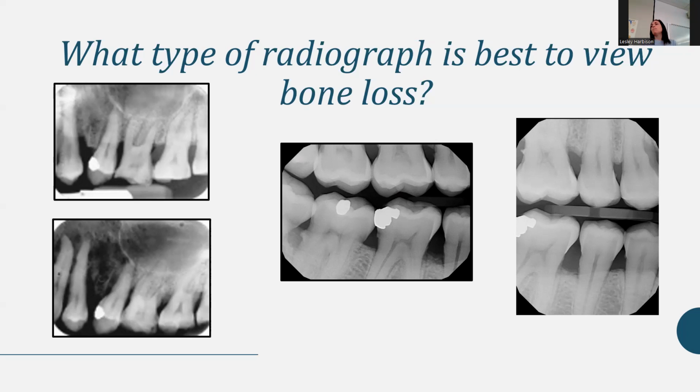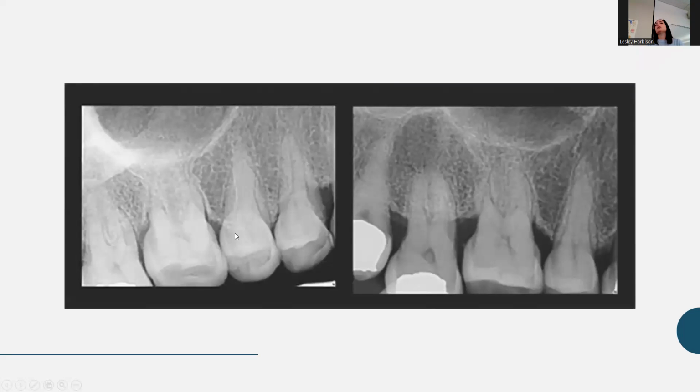So a vertical bite wing is a very good idea sometimes when you're just trying to get a nice accurate view of bone level. But you can just see how much variation that is. That's just so obvious. Here's another one, lots and lots of foreshortening. The bone looks far lower, but in reality, when it gets to be a nice parallel image, you can see how it changes so much.